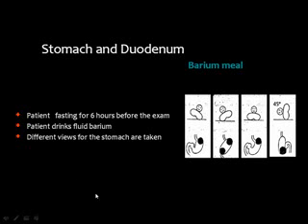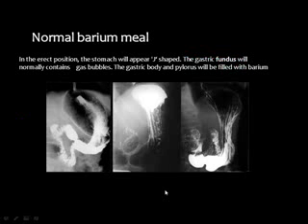Then we came to the stomach, and the stomach is examined by barium meal. And the barium meal is performed by introduction of barium solution by mouth. Then we change the patient position, raising his right side once and his left side once, supine film, lateral film, in order to delineate most of the gastric portions by barium and air.